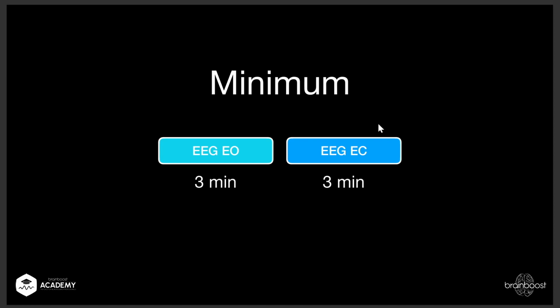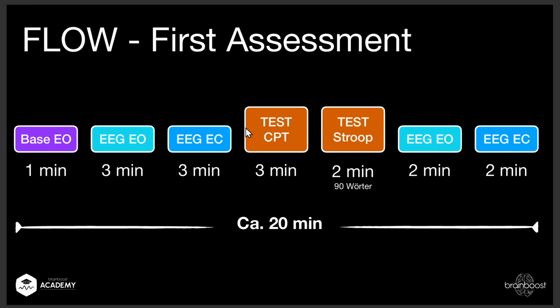I just showed you before how you can manually create segments, and this is something we need to get out. Generally, if you can do that, of course, if you have a 7-year-old kid, I don't know if they can keep their eyes closed for a long amount of time. Just give it a try. This is why you learned here how to perform this. But I think this is pretty sweet to have these 2 stress interventions. Also, the auto report will display, if you do these tests, the CPT, it will also automatically display the test results. So this is pretty cool. So it will automatically be added on the report after the categories.